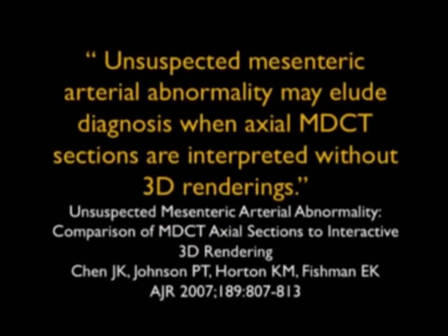Now, in talking about this idea about looking at images in the post-processing, it also brings us to the mesenteric vessels, about the importance of using the sagittal view, for example, in mesenteric vessels. But why don't we do this?